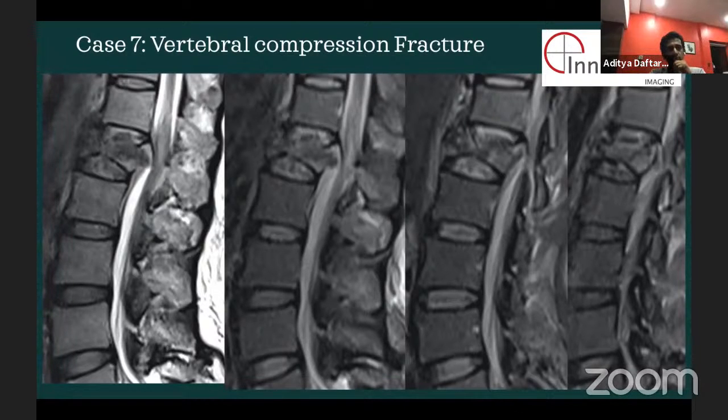Okay. So again, I think we are probably running low on time to some extent, but the idea really here is that when you see this vertebral compression fracture, the natural instinct is to just say, is this osteoporotic or is this a malignant compression fracture? And the issue over here, you rightly pointed out that there are some changes in the posterior elements. When you look really carefully, as compared to the other facet joint, there is some facet joint widening here.